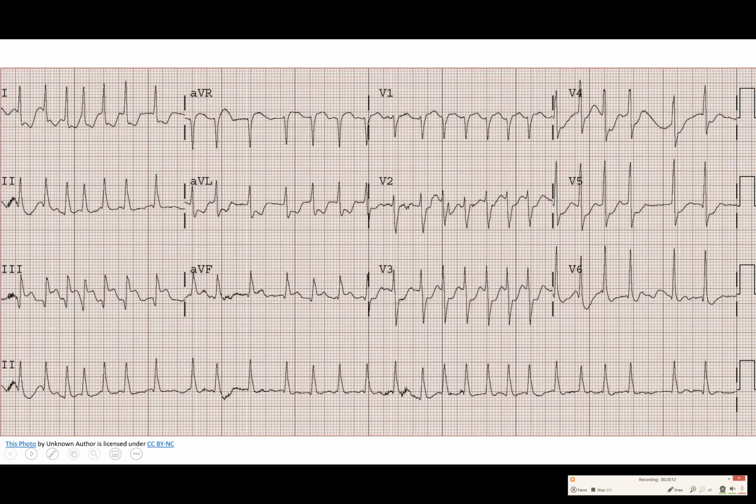All right, let's look at this one. Again, we've got the whole 12-lead ECG, but we're going to focus on the bottom here, lead 2 in a rhythm strip. First question, of course, is this regular or irregular? I think you can tell just from a quick look that this is irregular. Let's pick that distance compared to that short distance, and that's a medium distance. So we've got 4 beats in a row that aren't even consistent. So this is definitely an irregular rhythm.